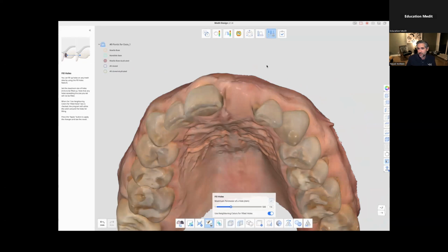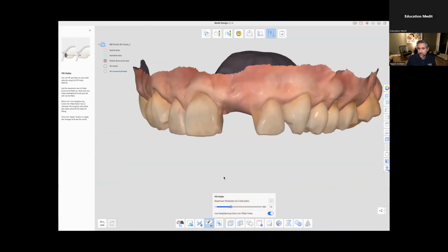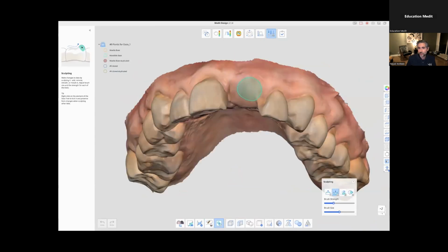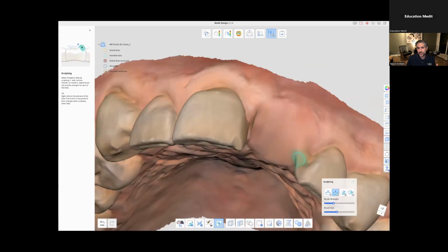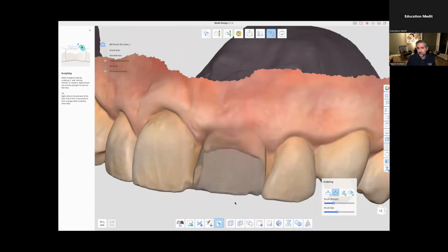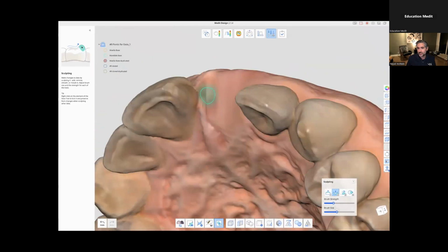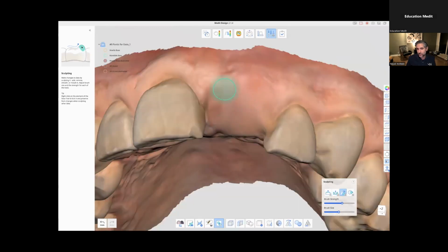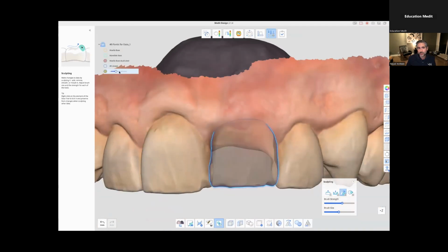So eventually you'll be able to get a nice extracted area, and I can toggle the number 9 clone in there. You'll also notice I duplicated my number 9 clone up in the layers panel, but I like to have extras whenever possible in case I mess up. So now I'm smoothing the ridge. I'm using the sculpting tools and the remove and the smooth tools to shape this, periodically turning on my number 9 clone.